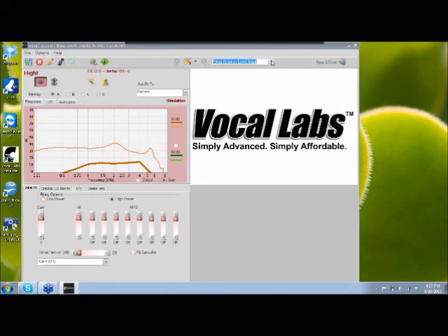So when I change these, each of these steps is a 4 dB increase. So when I go to intermediate, that target line should jump up 4 dB across the board. And when you go to final, it'll jump another 4 dB. Every time you change that adaptation level, you have to auto-fit accordingly, okay? I'm just bringing that up. It's not anything that's necessary to do. Most people just leave it on final and do their fitting from that point from the first place. You don't ever have to use that if you don't want to. But if you like to have those steps, you can use that.